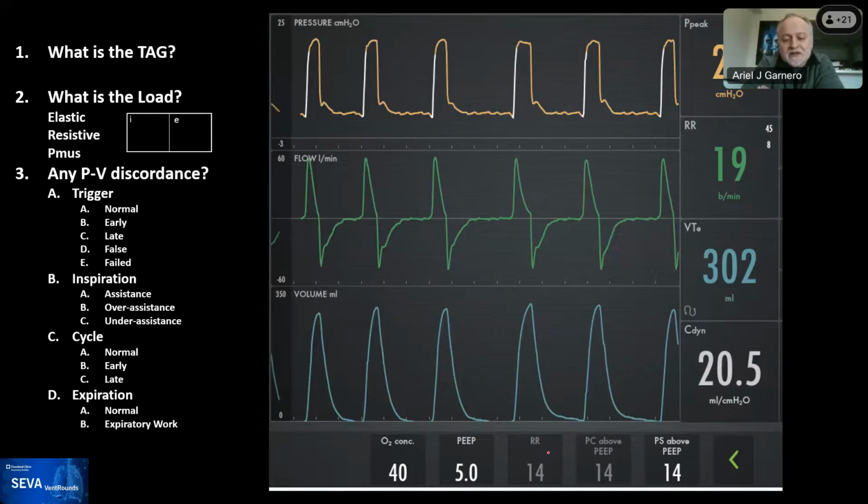And every single breath gives the patient a little bit longer apnea time until it reaches the maximum apnea time. So what Rob mentioned in the paper, this is an atypical way of automatically adjusting the apnea time. I don't know if I should say an intelligent way, but it's way shorter than any apnea time we know in pressure support. It's kind of, I would say, unusual. Yeah.